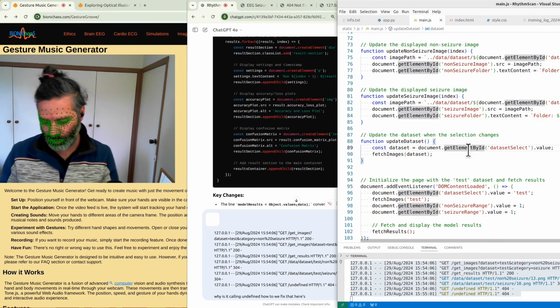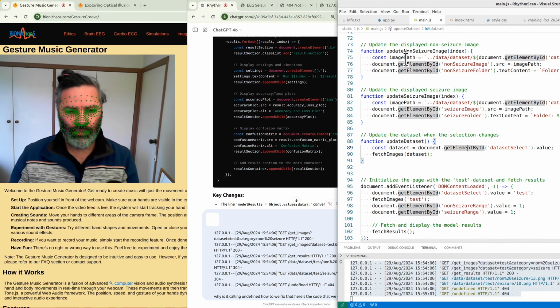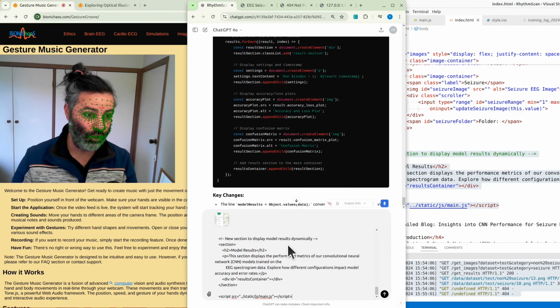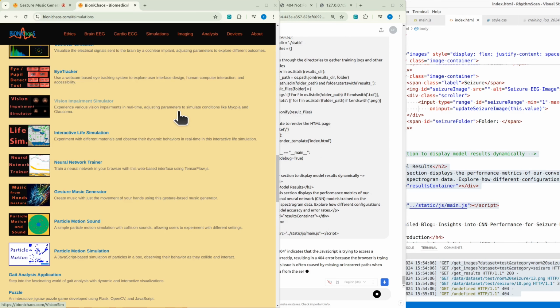Here's the code that we currently have for your reference, and the relevant code from the HTML as well. That should be plenty for you to be able to fix. And while it's generating or not generating, go check out the website.